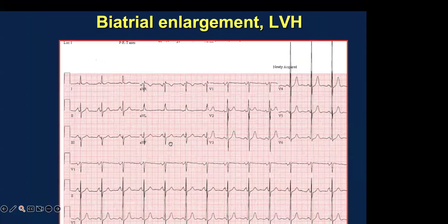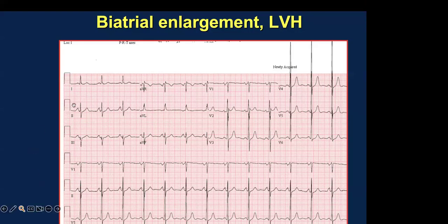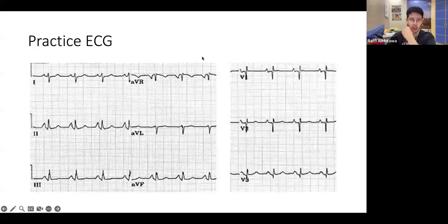So 2.5 height and taller is right. 2.5 width and wider is left, in lead two. Yes. Okay. All right. Then we have some practice, so let's try these out.